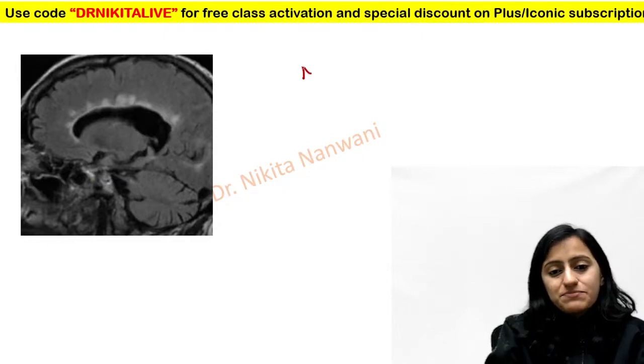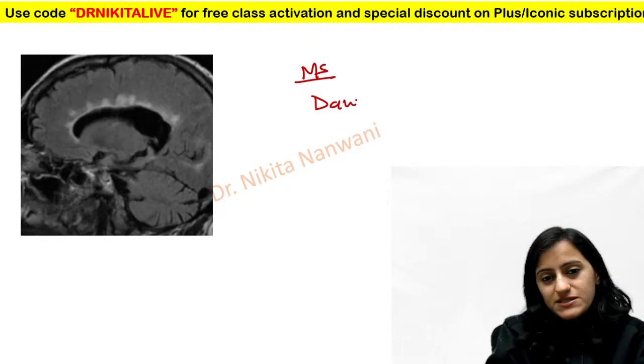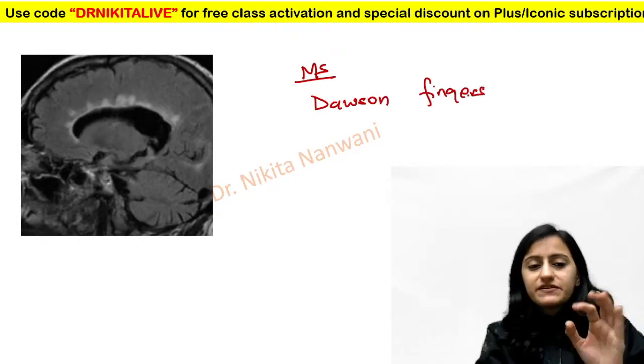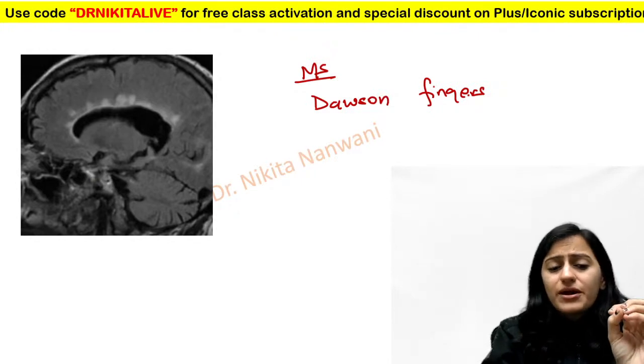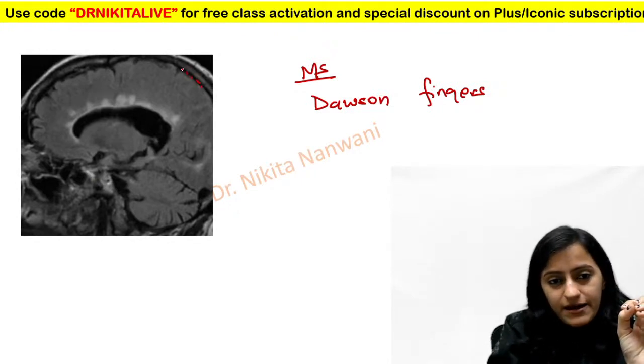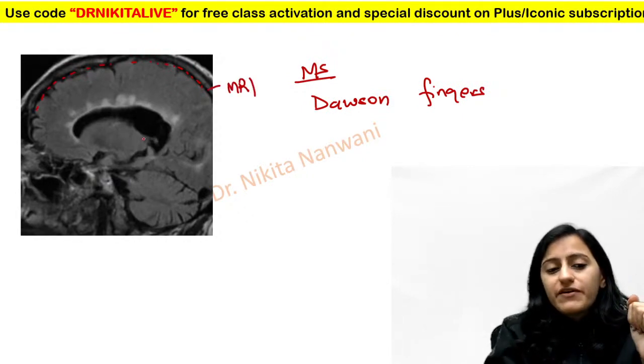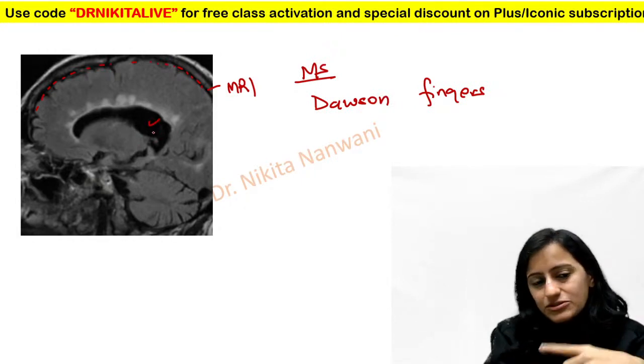Very good. This is multiple sclerosis because you see the Dawson's fingers here. Okay, multiple sclerosis, Dawson's fingers. Is this a CT or MRI? This is an MRI. You can see this black line here adjacent to brain parenchyma. What sequence of MRI? Water is black, so it's not T2.